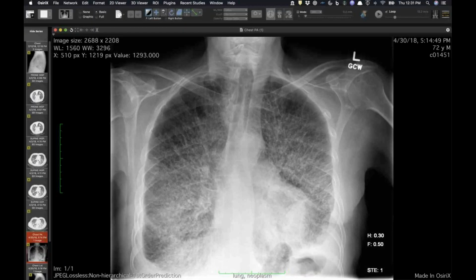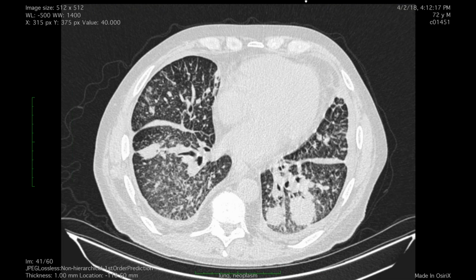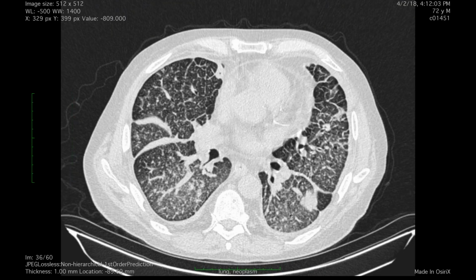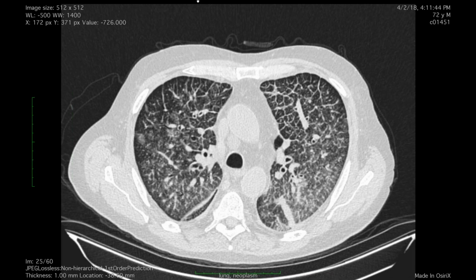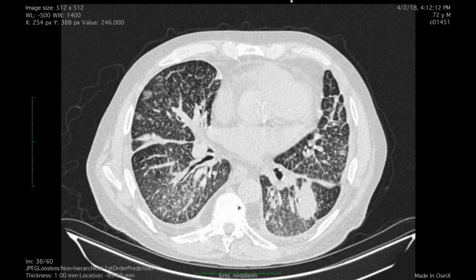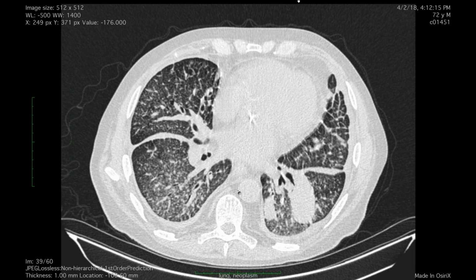So when he was referred here, we went through a whole differential. He didn't have a history of a known cancer, so I was wondering if he could have a lung cancer down here with diffuse lymphangitic spread, if this could be some weird amyloid deposition, some sort of other weird infiltrative process. I guess alveolar proteinosis, maybe, but sorry, David, what were you going to say?